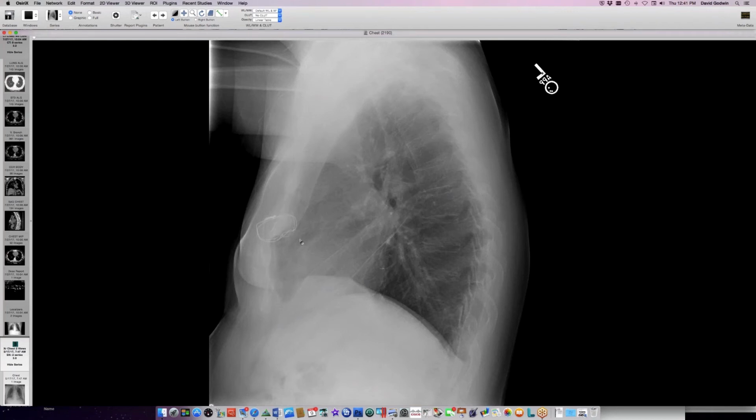And broken wires are pretty common. I don't know whether that sternal offset is pretty typical for all of our lung transplants. We were having this discussion the other day too. Usually they're not. Yeah, we see those here too.